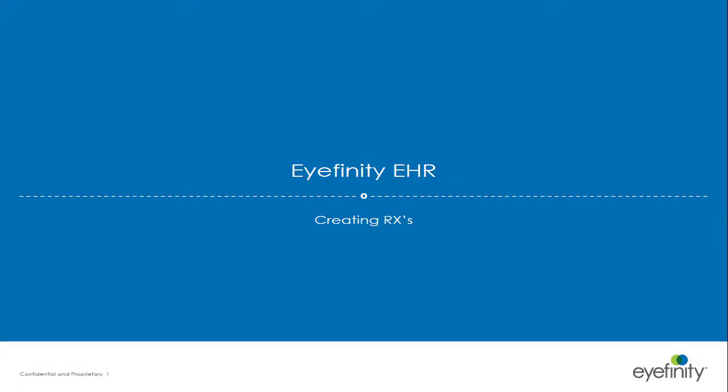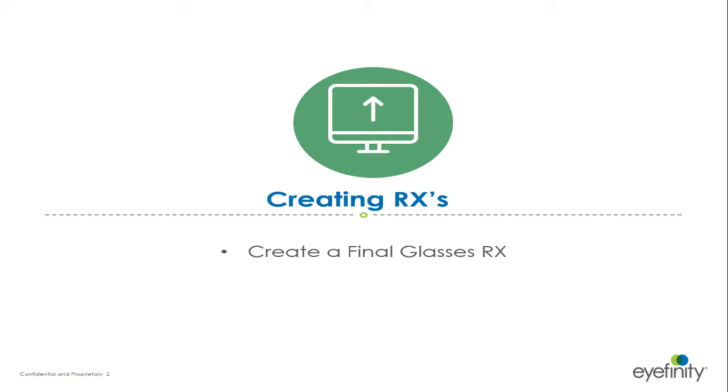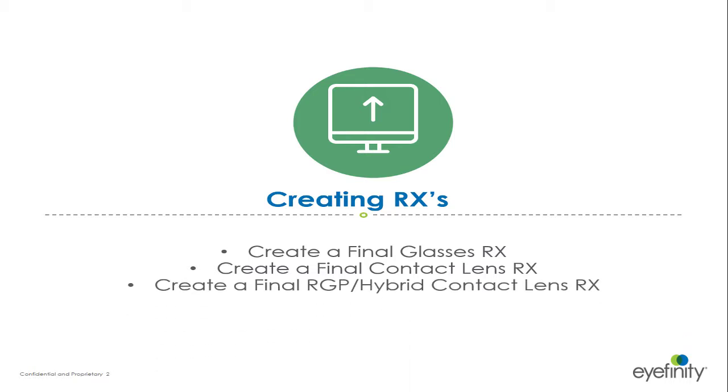This tutorial will cover creating RXs on the iPad. Following this tutorial, you will be able to create a final glasses RX, create a final contact lens RX, and create a final RGP hybrid contact lens RX.